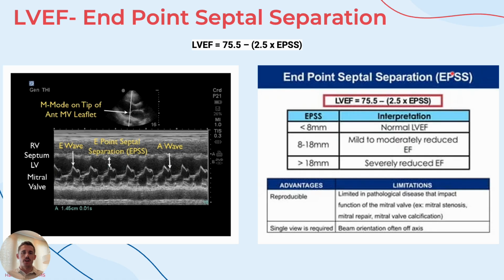There's a couple of apps out there that have this formula in them. I really like this. I believe it's from POCUS 101. Just having all of these calculations lets you do it if you're in a resource-limited place where you only have a single transducer that is not hooked up to a machine with any cardiac settings. You can just use M mode, calculate those with just a caliper, and then put them into this calculation to come up with an estimation of your left ventricular ejection fraction.